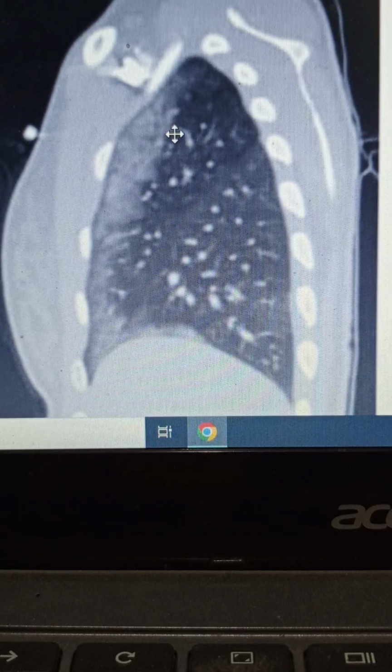So I repeat, a patient came to the emergency with increasing shortness of breath. He had a motor vehicle accident 6 hours ago. His initial chest X-ray was normal. But when a CT was done, there was opacity. So can you guess the diagnosis now?